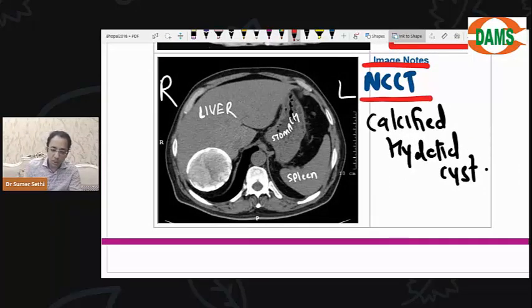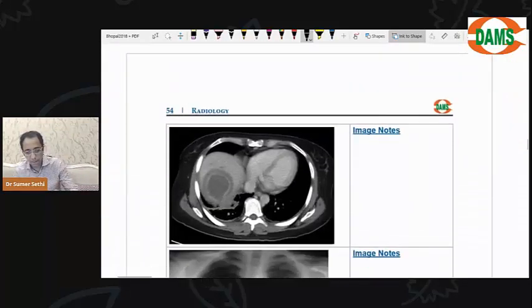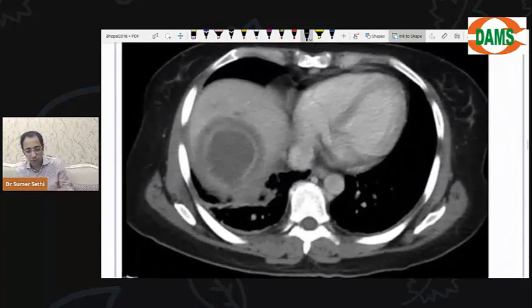And you can now guess that people who got this question wrong in the exam thought this could be a hepatocellular cancer. Later on, gradually in my class, I will teach you how to identify liver cancer also, don't worry. But so far, I want you to just see hydatid. Okay, now my question is, let's see if you can answer. Let's look at one more image together.